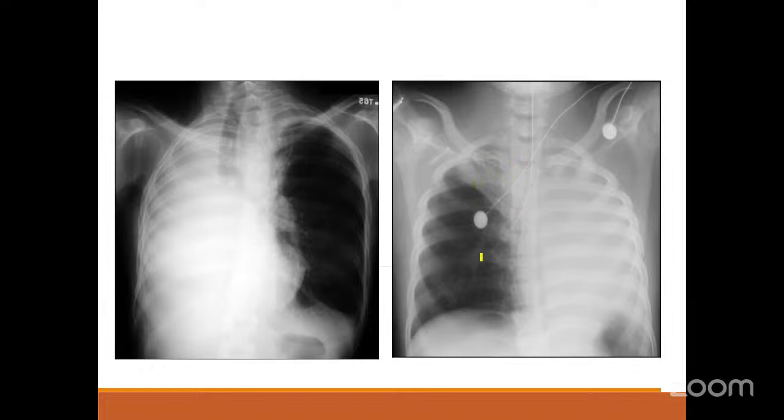It has gone straight into the right bronchus, and the left lung is not getting air, leading to a left lung collapse. That is what needs to be addressed here. So if this patient is hypoxic, maybe a simple intervention like pulling out the tube would help in oxygenating the whole of the left lung, which will bring back all the numbers towards the normal range.